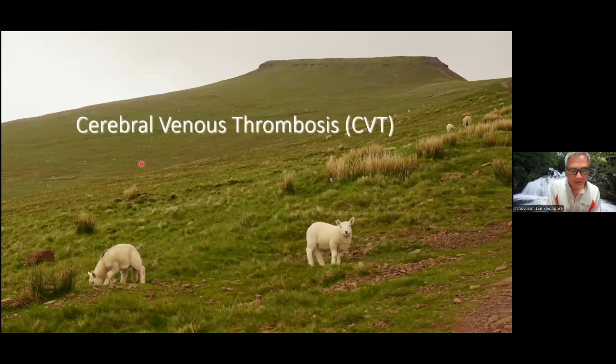So I hope that it wasn't too confusing in our description of cerebral infarction, where DWI is a very strong workhorse. Another class of cerebrovascular disease is venous sinus thrombosis.